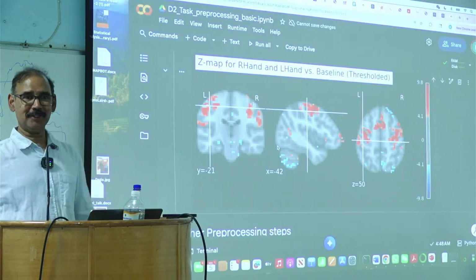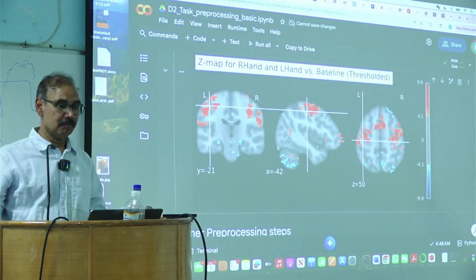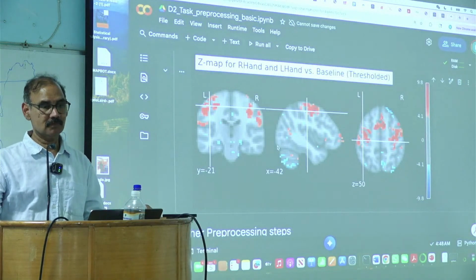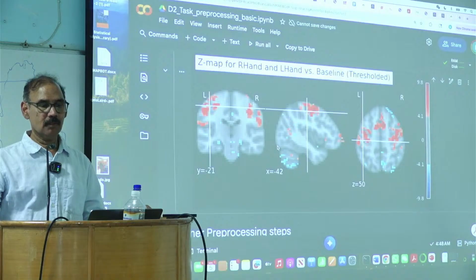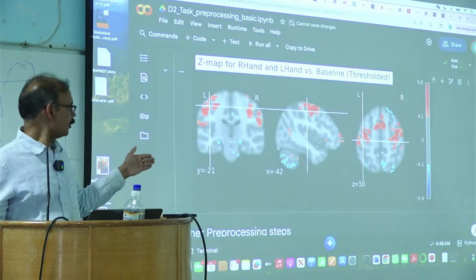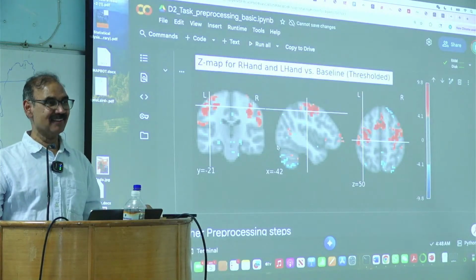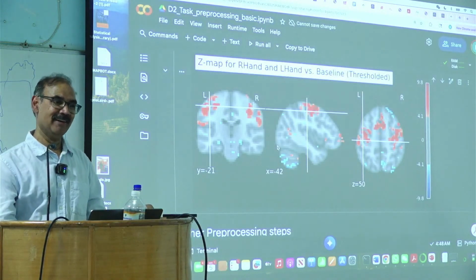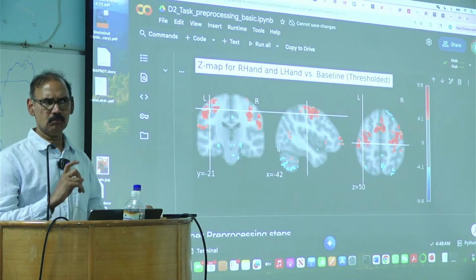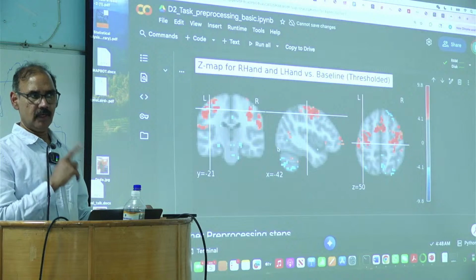How would you argue with her? Any? But this one looks so good, right? No, no, no. Okay, we are not looking at the baseline. Blue means negative, red means positive.